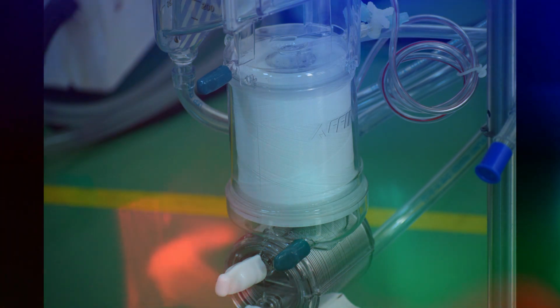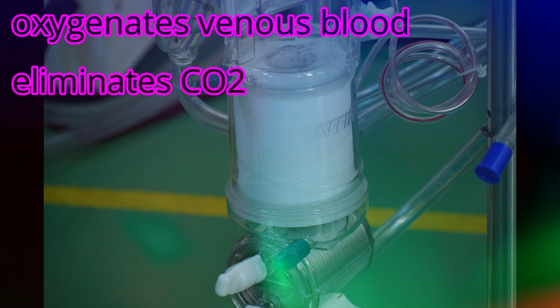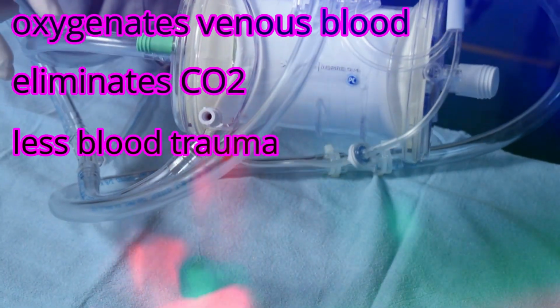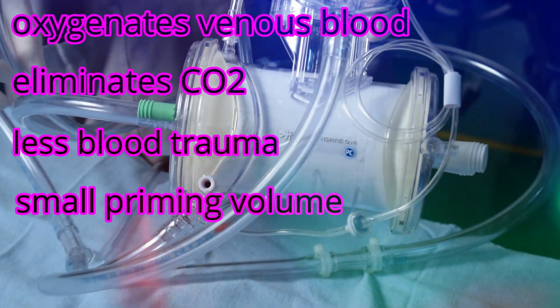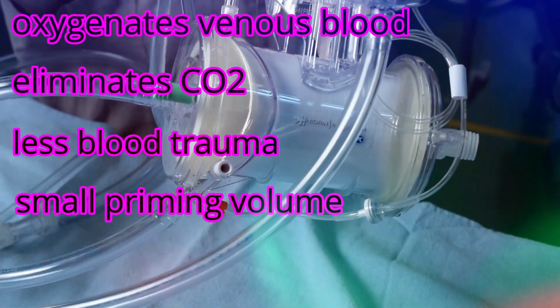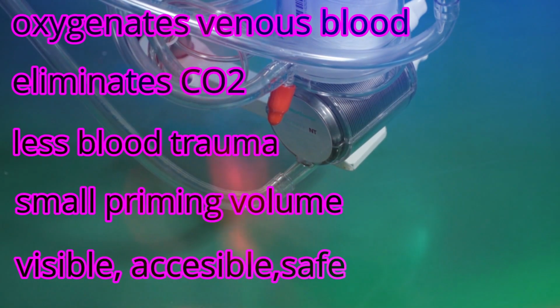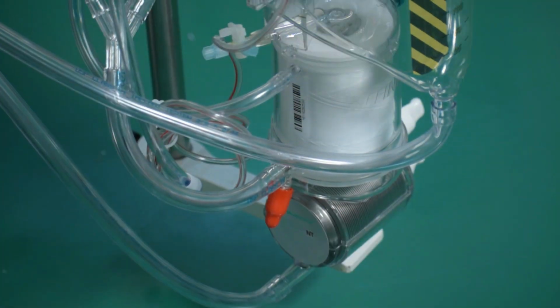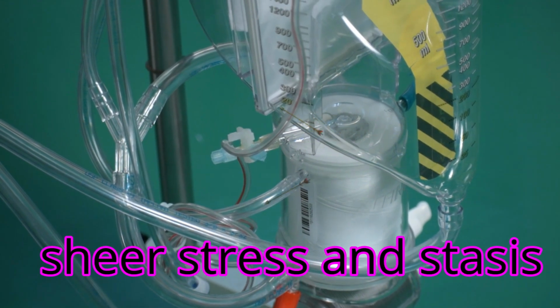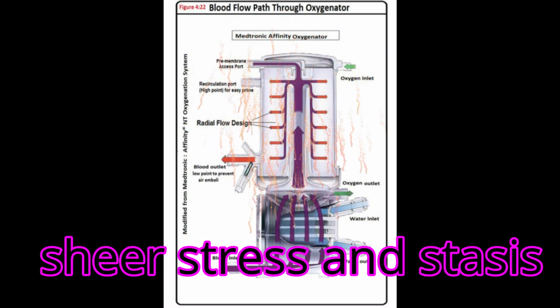So the ideal oxygenator would be one which oxygenates venous blood, eliminates carbon dioxide with minimum trauma to the blood that is induced by direct exposure of the gas to the blood, has a smaller priming volume which has impact on hemodilution and protein concentration, and one which is highly accessible, visible and safe with a very less possibility of air embolism. The most influential factors that affect blood trauma in an oxygenator are related to how blood traverses the device and are termed shear stress and stasis.